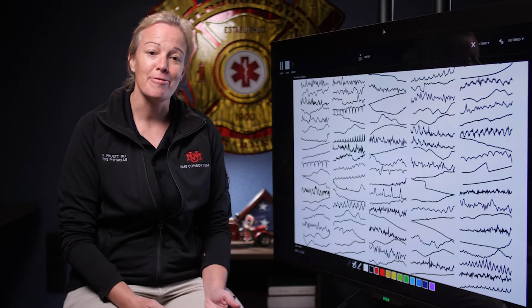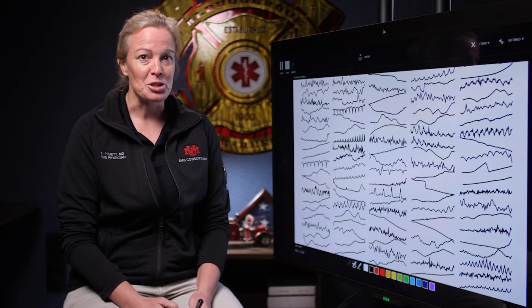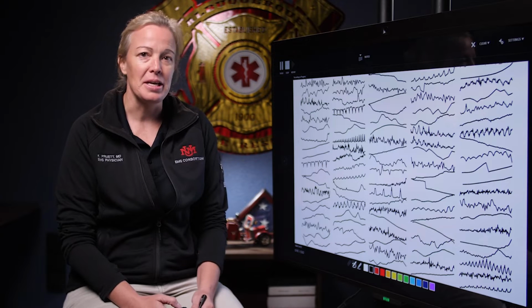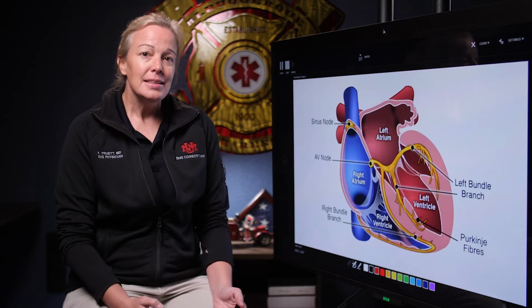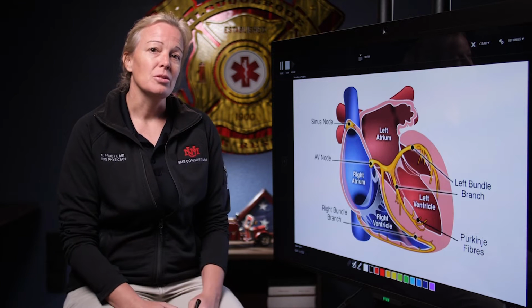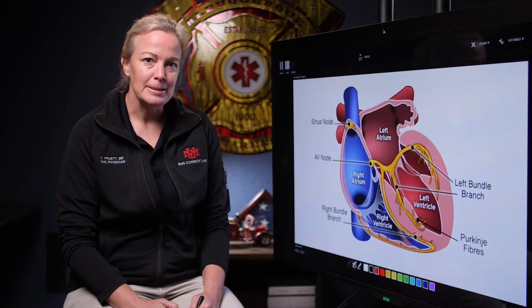And I know when I first started in medicine, and I suspect for a lot of you folks too, when you first looked at a 12-lead, it looked like a bunch of squiggly lines that made absolutely no sense. And so the idea today is to hopefully make some sense out of those lines and be able to understand what's going on with the heart electrically when we look at these 12 leads.